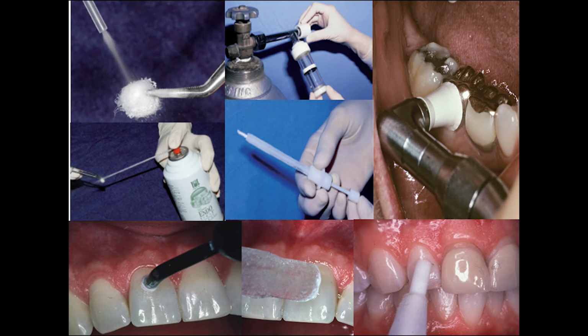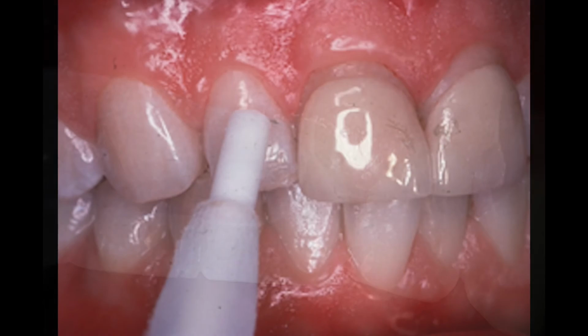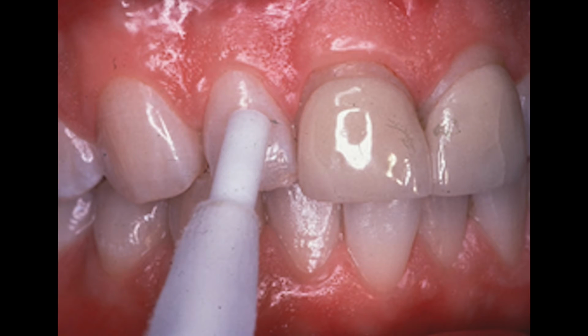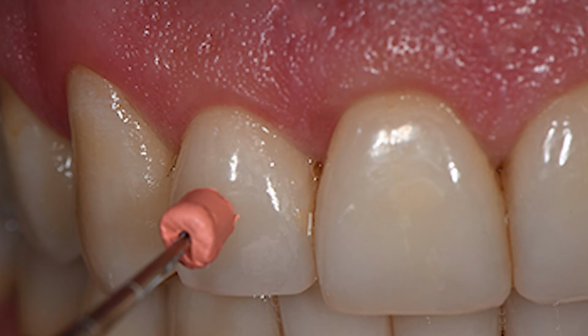Different methods have been used to apply a cold stimulus on a tooth. They include ice wrapped in gauze, ethyl chloride, and frozen carbon dioxide. There have been different methods to apply heat stimuli on a tooth. They include warm water, heated gutta percha, hot burnisher, rotating rubber wheel, and System B.